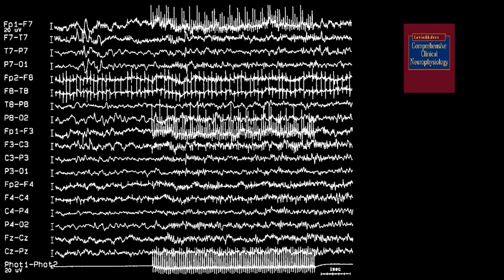I also find interesting that in an epoch published in Levin and Luthers, the electrode artifact triggered by photic stimulation is negative. As you can see in this frame, there is a negative artifact arising from FP1 coinciding with the photic stimulation. The fact that the artifact is negative is not consistent with the theory that explains the artifact as being the product of photons dislodging electrons.